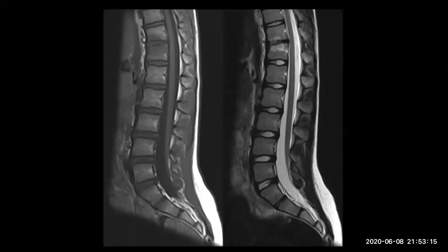Doctor, I have a question, please. Please go ahead. Doctor, can you describe for me, in this case, is the disc normal or abnormal? The disc space height is normal, but the signal inside the disc, especially in the nucleus pulposus, is a little bit high, but not increased to water density to suggest infection.